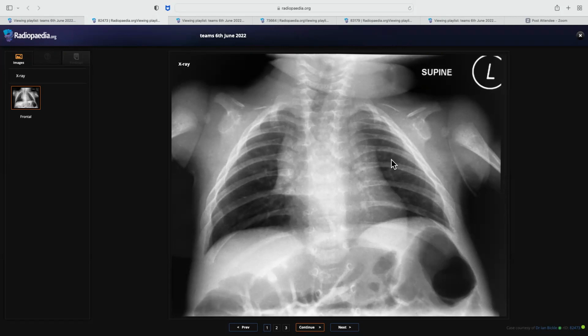At that point of time, when you're not able to find anything, you can start recollecting. Okay, here what all bones do we see? It might be a congenital thing because it is a small child like that. If it's congenital, let me see whether all the bones are there or not. Maybe like that you can think.